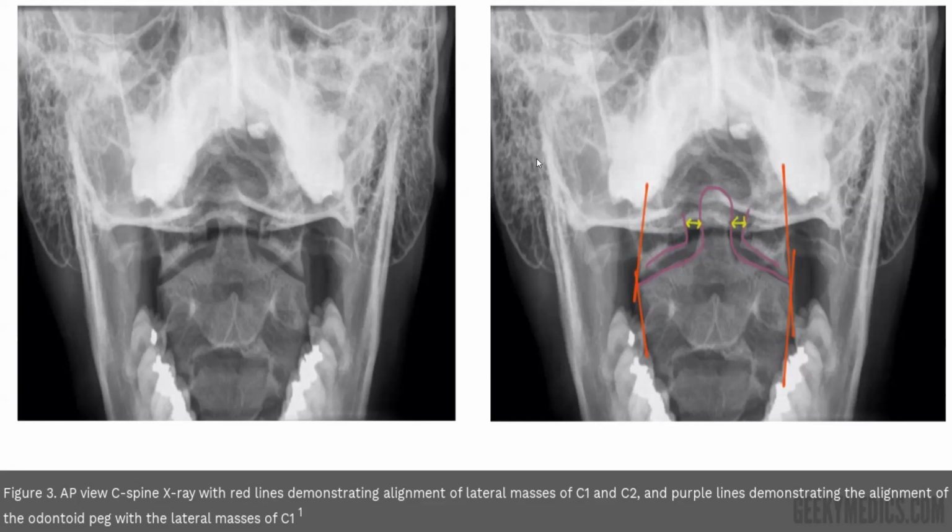Okay. Is this one normal or abnormal? Normal. So the distance on this side is not equal. So here equal, here equal. Is it centered or not centered? I mean, is the X-ray centralized or not?